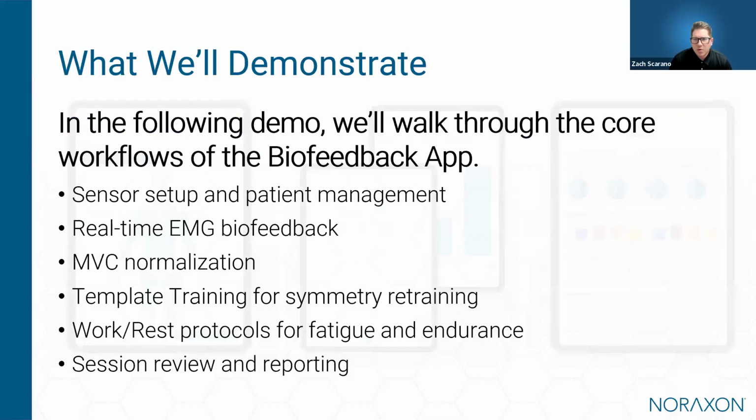So in the next few minutes, we'll walk through the core workflows of the biofeedback app. We'll start with sensor setup and patient management, and then move into the real-time EMG biofeedback. From there, we'll demonstrate MVC normalization, threshold-based training, and the two specialized training modes. Again, we've got template training for symmetry retraining, and then the work rest protocols for looking at fatigue and endurance profiles. And then finally, we'll look at how the recordings can be reviewed and reported directly within the app. And so, with that overview in mind, let's go ahead and take a look at the biofeedback app in action.